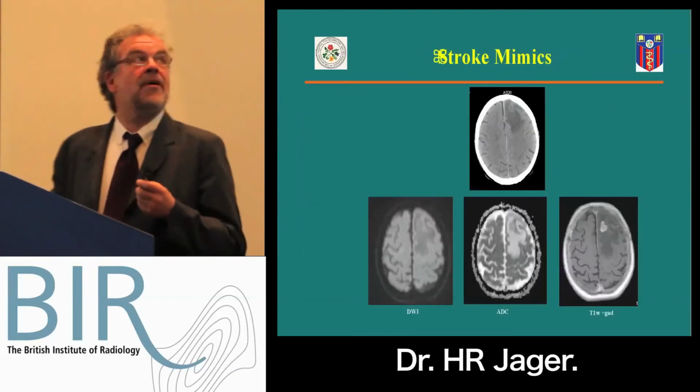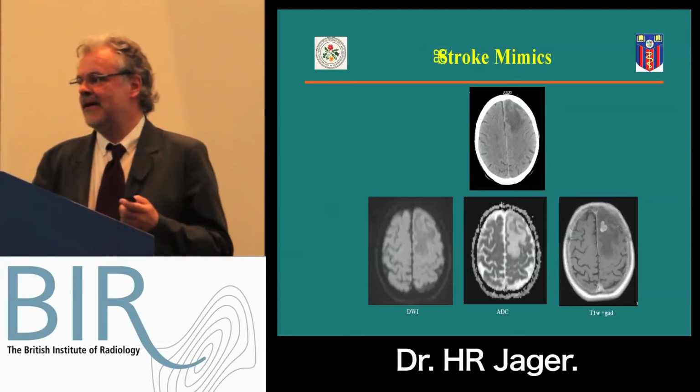So who thinks this is a stroke? Probably none of you, because it says stroke mimic.